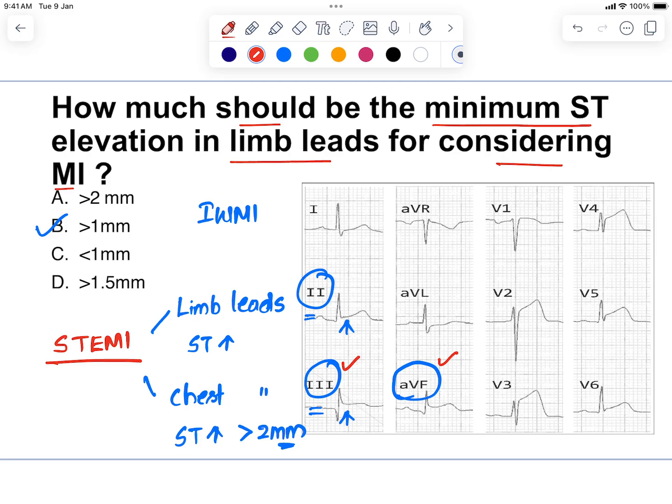But what you have to remember is the ST segment elevation is not just present only in cases of the myocardial infarction. There are many other conditions where you can have ST segment elevation. Now let me discuss and let me show you the ECGs of all other conditions. And regarding the ST segment, we will be discussing the conditions where you have ST segment elevation, and we will be discussing the conditions where there is ST segment depression. These are the two abnormalities related to the ST segment.